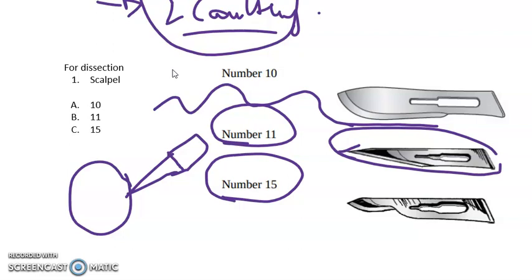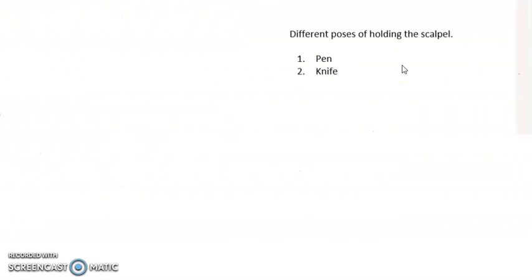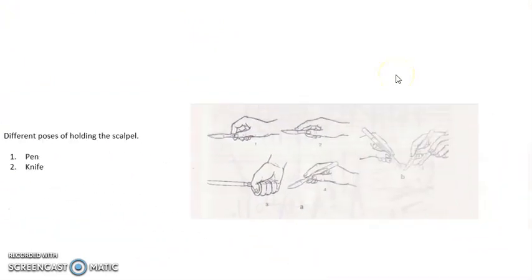Basically incisions, as well as making an incisional wound. What about here?